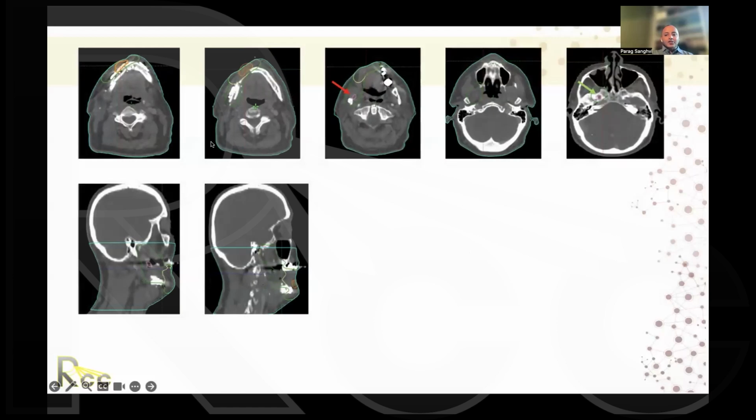And now this is a patient of mine, again, kind of showing you the postoperative setting. So you can see contouring this very generously. You can see contouring the hardware in this case. And again, in the postoperative setting, it's always very challenging because all of those bony landmarks are lost. So you can see this patient's had a partial mandibulectomy. So symmetry is very, very helpful.